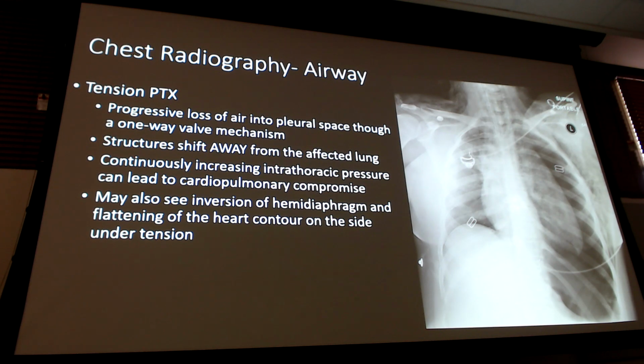Okay, so here's another tension one. You wanted your deep sulcus sign? There it is. Right? Supine x-ray, deep sulcus sign, well down into the abdomen. That's what the deep sulcus sign looks like. Looks like the left lung is almost an entire third larger than the other lung, right, where the pneumothorax is. Why is that? I'm supine, the air can't just go up, so it kind of spreads out, pushes things all over the place. We get the deep sulcus sign on the supine x-ray.